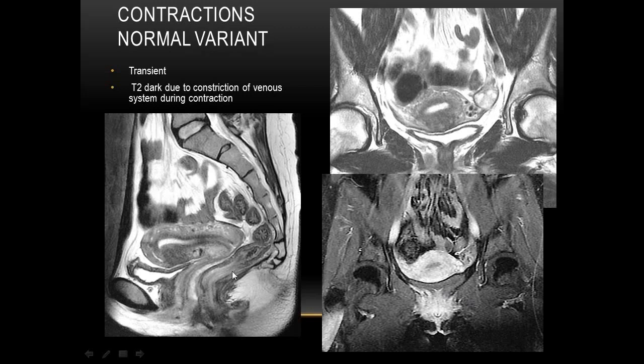study. This is earlier in the MRI sequences. This is later. By the time we have given contrast enhancement, this finding has resolved.